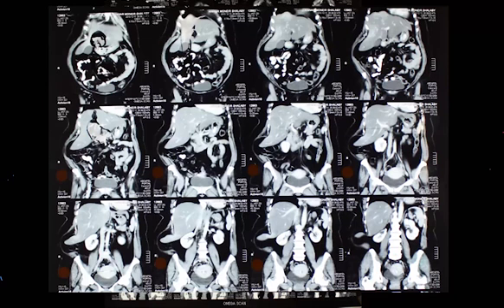But you can see the skin. You can see the skin that is hyperdense, and you can see all the fat that is hypodense. It's not only the bones. With an MRI, the fat appears high signal on some sequences, but it doesn't appear the same on others. Fat will appear homogeneously low density, hypodense, on all CT images. You don't talk about a CT sequence, you talk about an MRI sequence. But with all CTs, the fat will invariably appear hypodense. We can have another look.